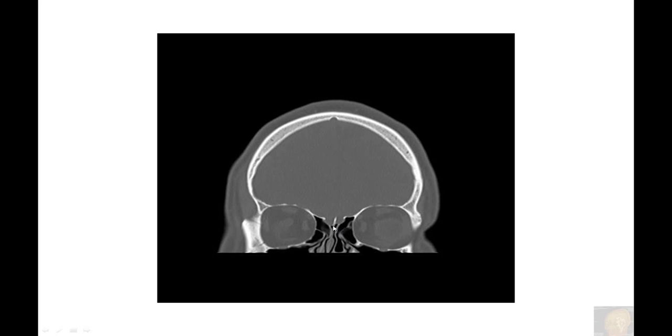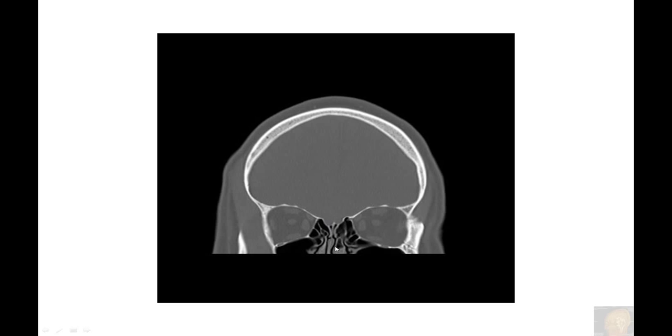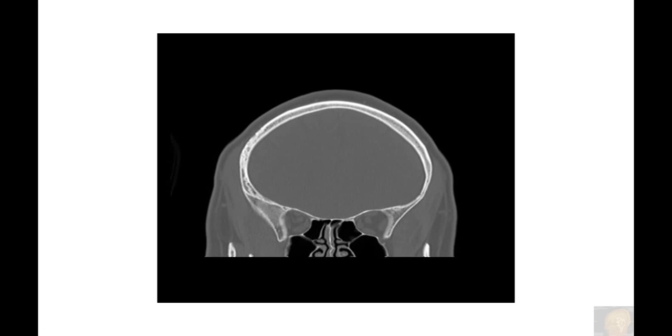That part can also be broken, or if there is a tumor involving the olfactory nerve, such as esthesioneuroblastoma, it can easily grow towards the brain and through this bone into the nose. Moving more posteriorly, and here we are moving.